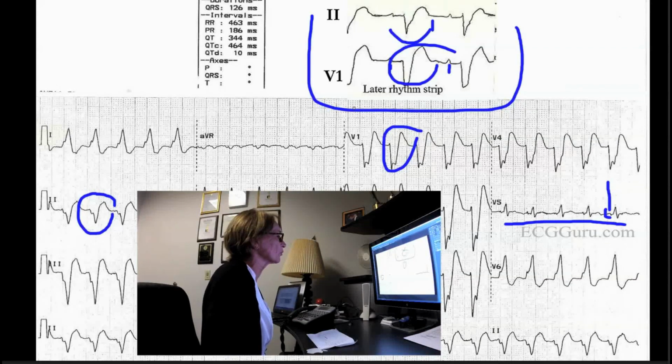That's another topic. We'll talk about it some other day. It's more rare, but it does happen that people mistake sinus tach for VTach. But now we're talking about mistaking SVT for VTach. I just wanted to assure you that if you do get them wrong, as long as you follow the rule to treat as VTach unless you know for sure otherwise, your patient will be safe and you'll give good treatment. But it is interesting to see how we know the difference.